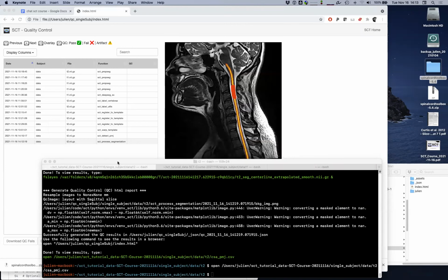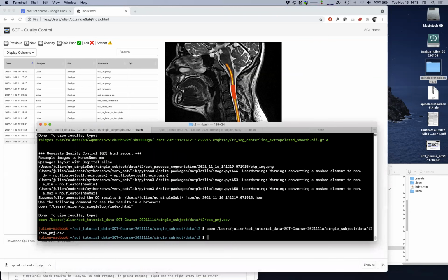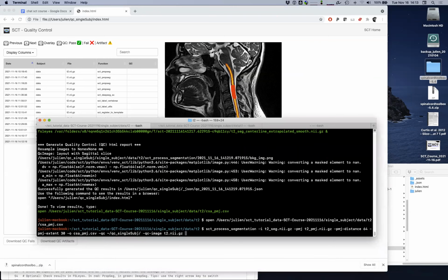Luis, yes? Could you report slices within that window? Yeah, actually, I've never tried it, but can we? Let's try. Can we do a per slice? It will be a world first. Pretty sure it's an issue right now to add the per slice. Let's see.